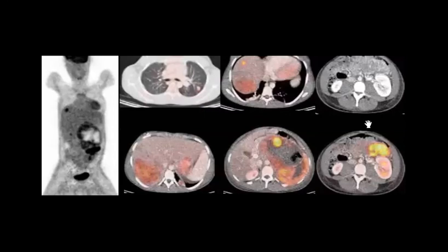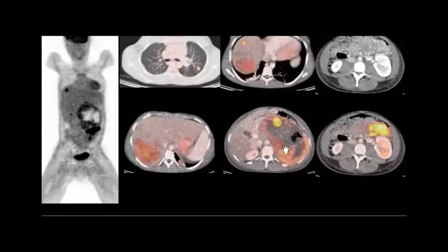Okay, I see again. Okay, perfect. You think about maybe something going on in the adrenal gland. Adrenal lesion. Left adrenal, yes. So what is going on in the left adrenal? High uptake. Very high uptake. Yeah. And maybe it's in the liver and pulmonary too. And you can see the appearance here, yeah.